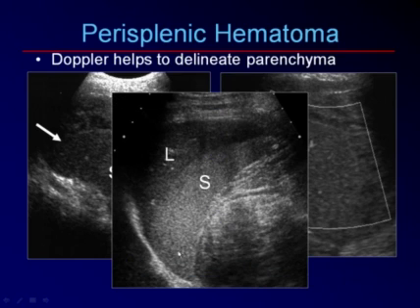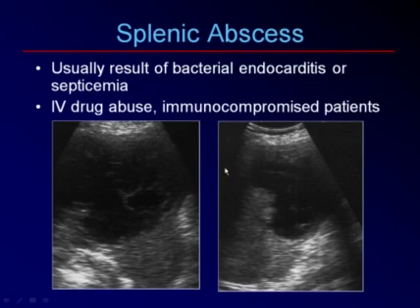Another thing that you should be aware of is that the left lobe of the liver can come around and hug the spleen. Now it gives kind of a two-tone, double-shaded appearance to the spleen. The splenic tissue itself is homogeneous, and look for little portal vein walls inside this piece of liver that's coming way over to the left from the left lobe. This is easily mistaken for subcapsular hematoma. So if you see such an appearance, think of liver adjacent to spleen rather than a hematoma.